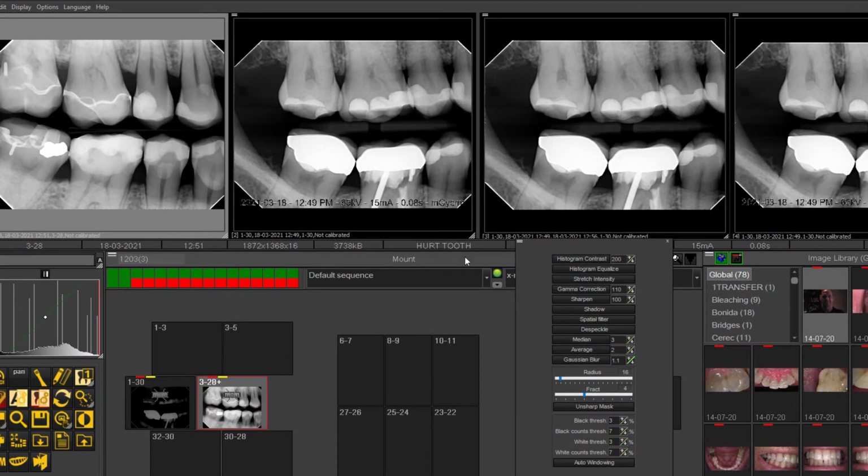So I can take an image now and utilize a wide variety of parameters in a different sequence as well and change an image. When I say that these buttons are programmed, it's after I have treated the image with a variety of these filters here, then I would save that as a type of filter.